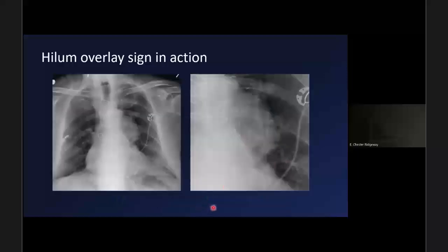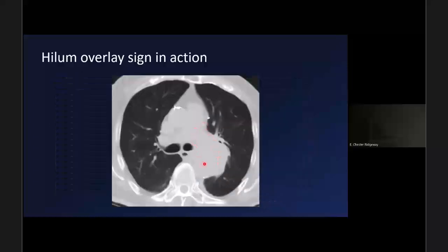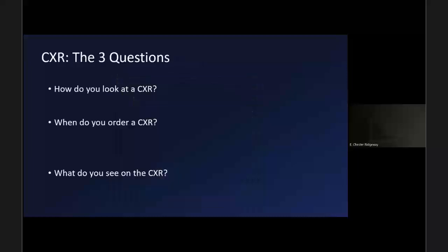This is on the flip side of that now. Again, we still have a left-sided hilar mass, but notice now here in that central area, we do not see any vessels. There's nothing there except surgical clips. That's what those little linear opacities are. So in this case, it tells us that this is a hilar process. It is involving the hilum. It is involving the middle mediastinum. And you can see here how this mass is completely involving that left hilum there.